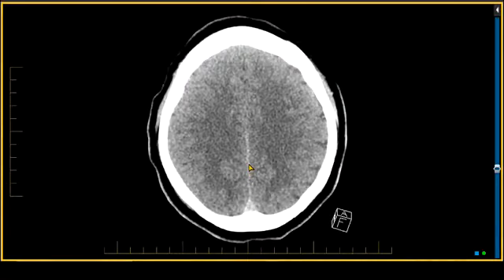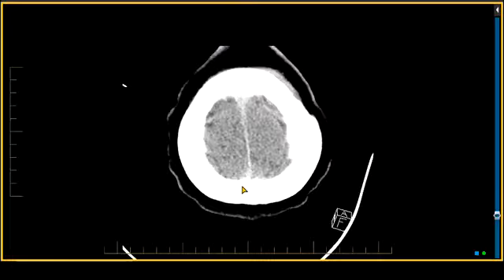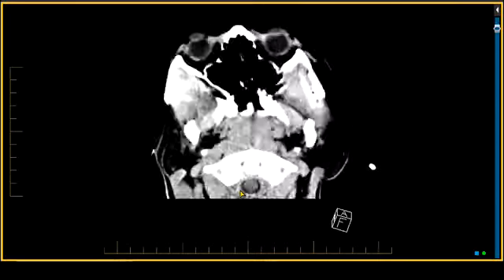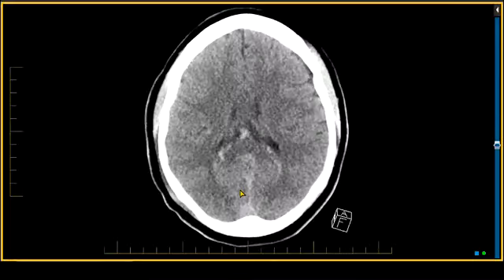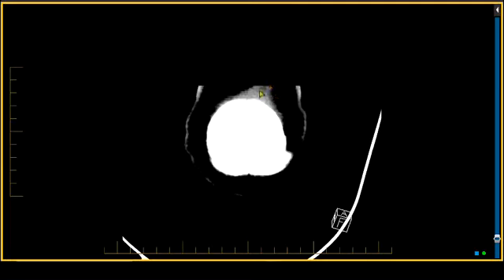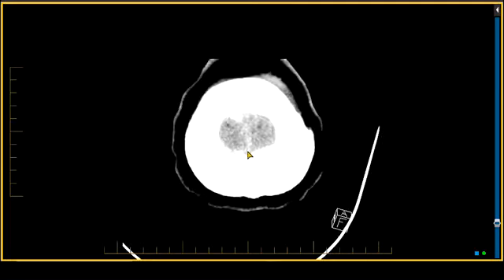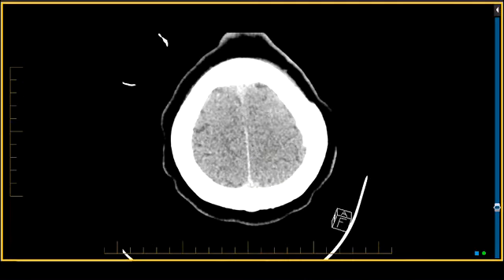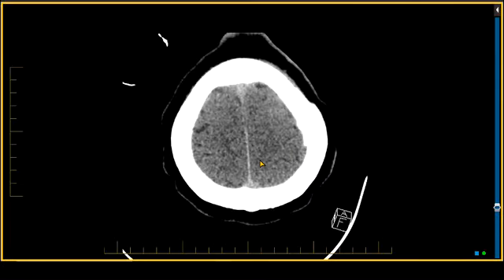This was an individual who was trimming trees and fell from his truck onto the asphalt. This is the initial CT scan from the patient's study, and the initial run-through suggests that the patient has had an injury in the scalp at the high left frontal region. We're going to look at the calvarium in just a moment.